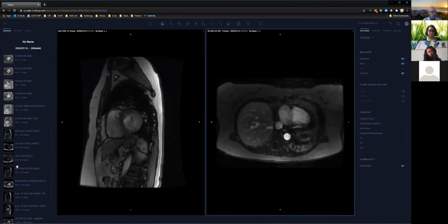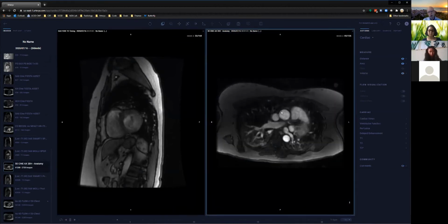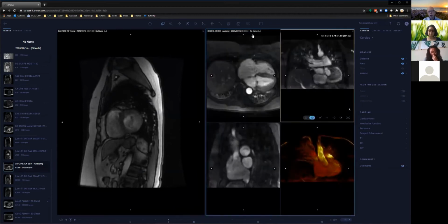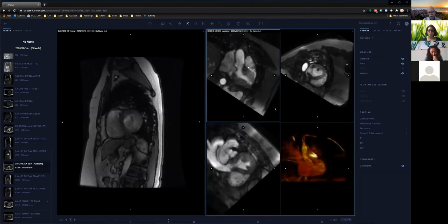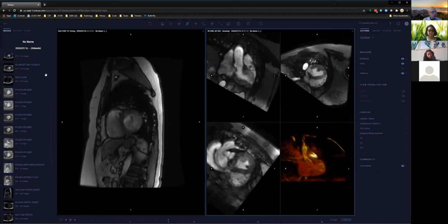This is just a preview sequence here. The full cardiac gated MRA follows here. Let me see here. Which gives us some more detailed anatomy that can be 3D reconstructed like a CT. I don't know if you also do a lot of cardiac CT there for function or congenital heart disease. So anyway, that's our typical protocol.